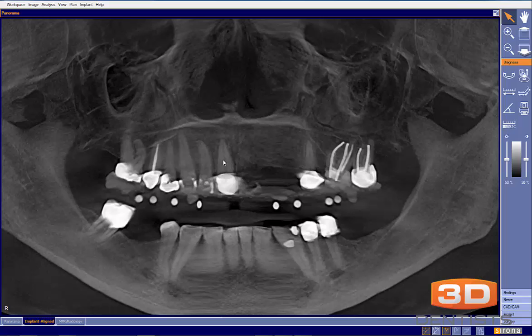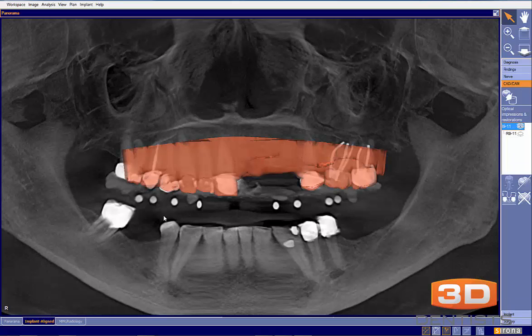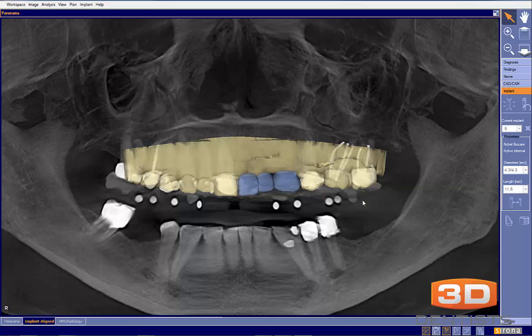So that's step one. The good news in this particular case is that sometimes with all ceramic restorations like tooth number 14 here and 6 and 7, we are able to get the CAD/CAM data to stitch quite nicely, and this happens to be one of those cases. Now, this dentist also had designed a nice 3-unit bridge as one restoration. So everything looks good from this end.